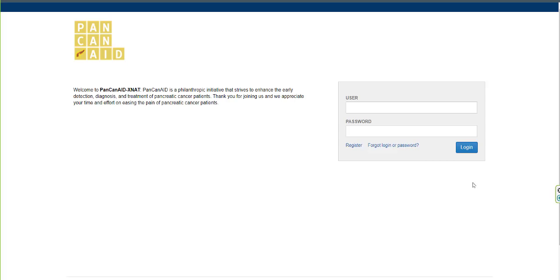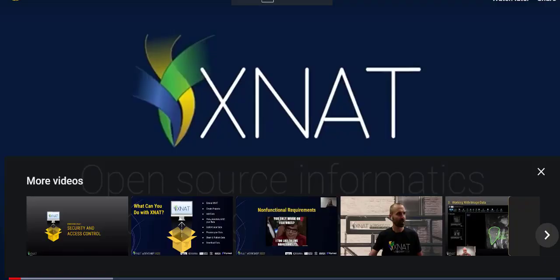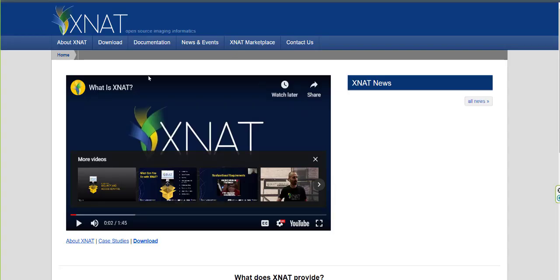So I want to introduce XNAT to you and how you can log into your account and use XNAT actually. So let me open up the XNAT web page. XNAT has a great introduction video on their page. So this is their page. It is open source.